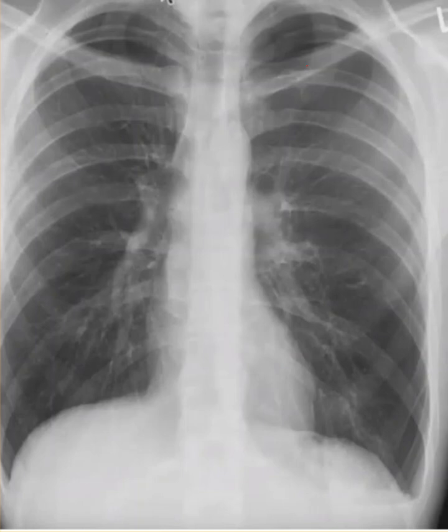So when you're reading a chest x-ray, you need to read it systematically every time on every film. And the method I use is the A, B, C, D, E method. And A stands for airways. And so we go to our airway, and here it is here, of course, coming down.